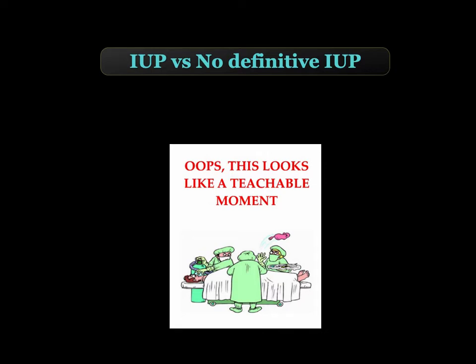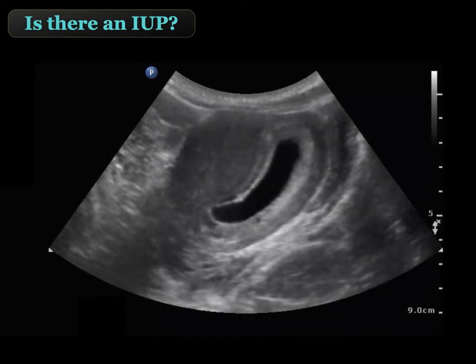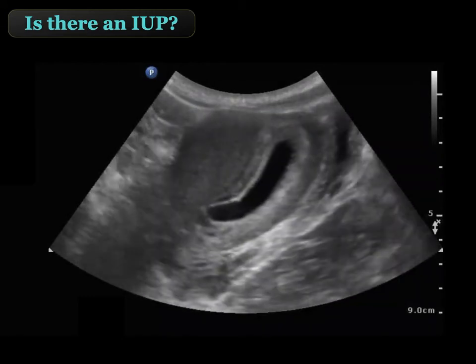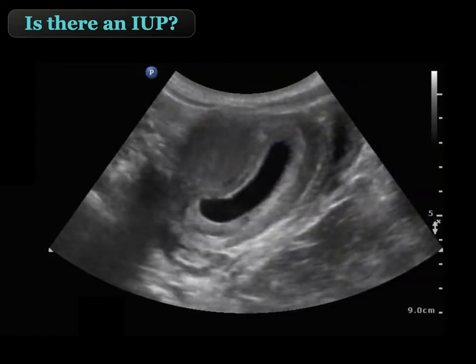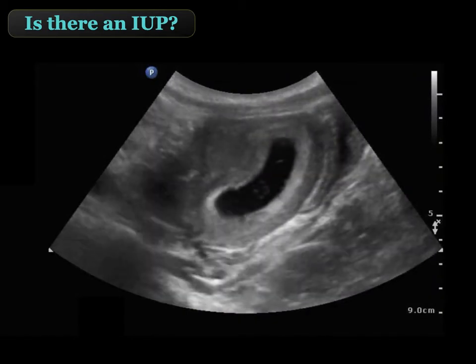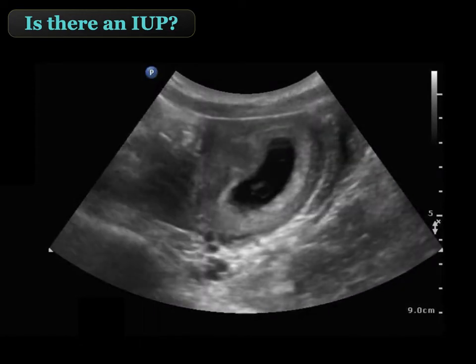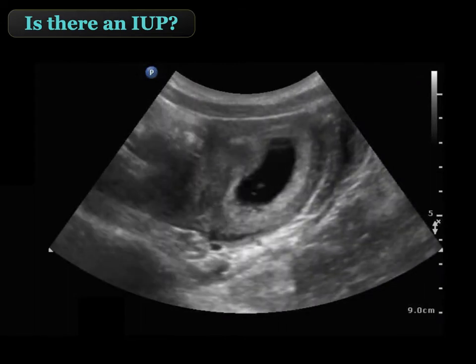So let's look at a few different images to determine whether we see an intrauterine pregnancy or not. So here's a nice view. This is a curvilinear probe. We have the uterus in a longitudinal or sagittal approach, and we see a very large hypoechoic gestational sac. Within that gestational sac, we see our Cheerio. This is known as the yolk sac. So this is an example of an intrauterine pregnancy.